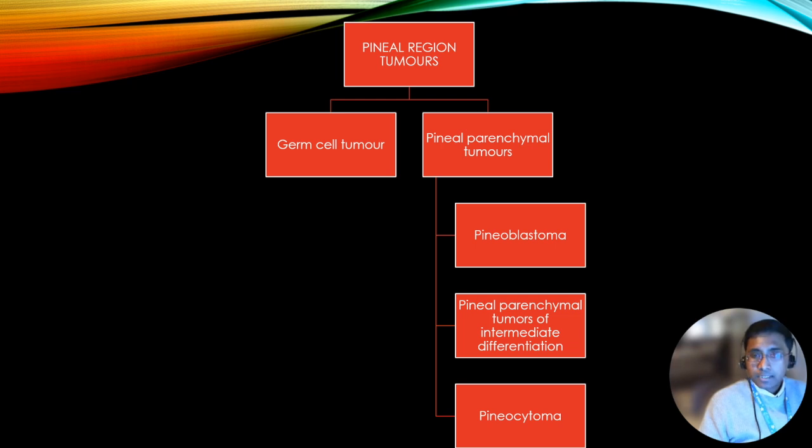This is very characteristic for a choroid plexus tumor, and that one actually turned out to be a choroid plexus carcinoma. Many a times it is very difficult to differentiate between the two entities, choroid plexus papilloma versus carcinoma, and it is only proven by histopathology, but gross invasion into the brain parenchyma is one way to be confident about it preoperatively.